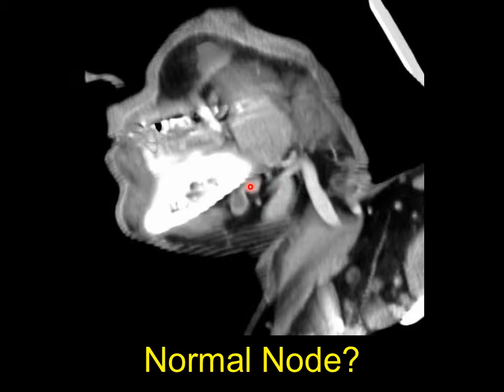This is a 3D reconstruction I made of that same lymph node. Again, this node is kidney bean shape. This node has a nice fatty hilum. This nice node is relatively homogeneous otherwise, with enhancements similar to other lymph nodes in the neck, but it's clearly an abnormal focus within the node, even though it meets the size criteria on imaging. So we want to remember those imaging characteristics of abnormal nodes.